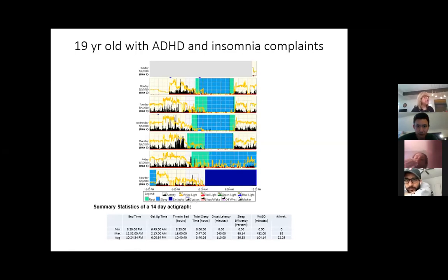And you can see the person probably had the TV on right there because there's low light, and then they turned the TV off, or they got under the covers and you can't see the light anymore. You see that? Ambient light, maybe TV light, maybe jammies on, and hand and device under the covers. Everybody good with that?